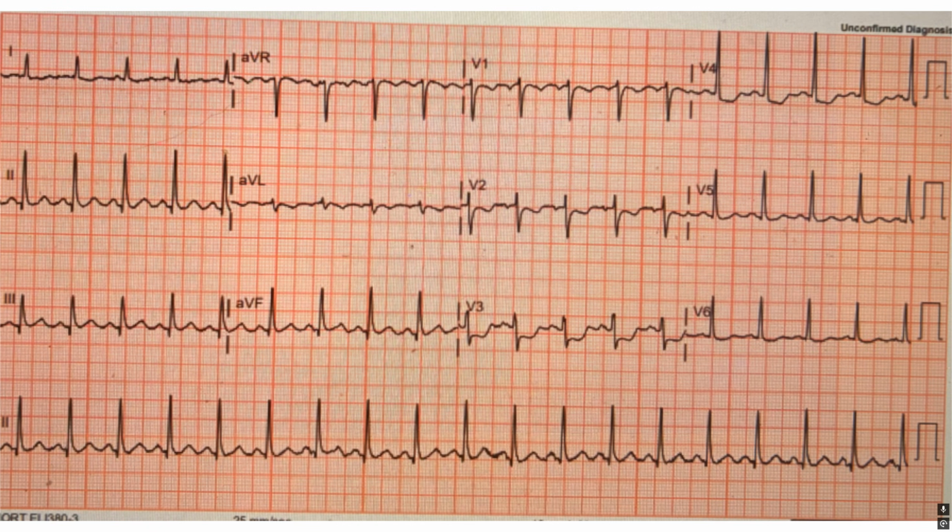Ooh, now let's look and see what we got. Now, down here in my rhythm strip, I'm seeing sinus tachycardia, okay? Up here in AVL, not only do I see the same inversion and linearity, but now I'm seeing some J-point deviation. No real J-point deviation, but now we're inverted here. No real J-point deviation. J's look okay, but still these linear T waves here. No J-point deviation. No real J-point deviation. Now I have some depression here in V2.